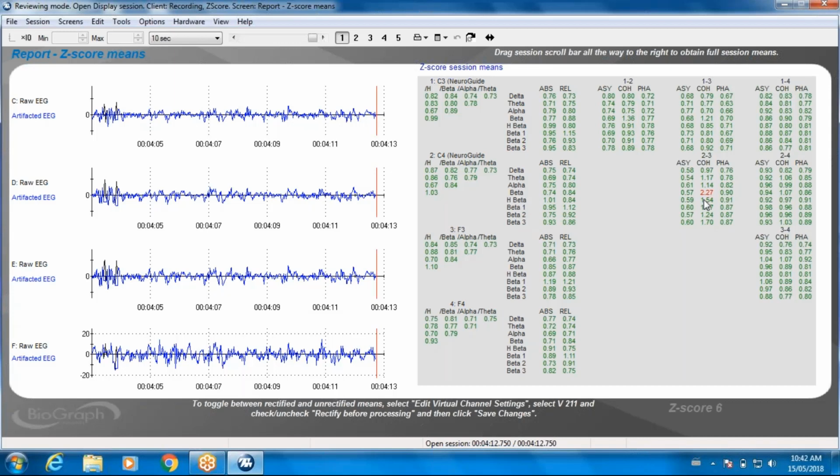I'm not going to give you any clinical context for who this individual is or why they're there in the clinic, but this is how the evaluation would work in order to identify norms that perhaps are maladaptive or not useful for their day-to-day functioning.